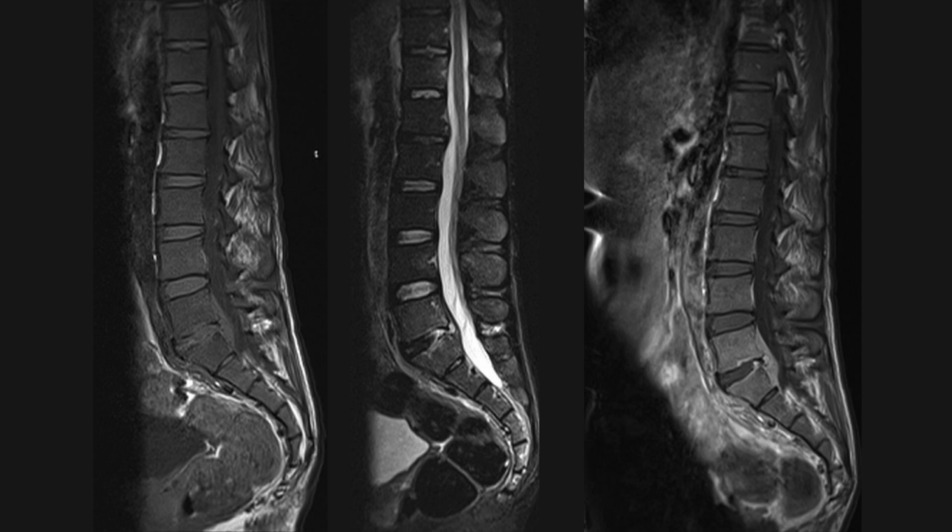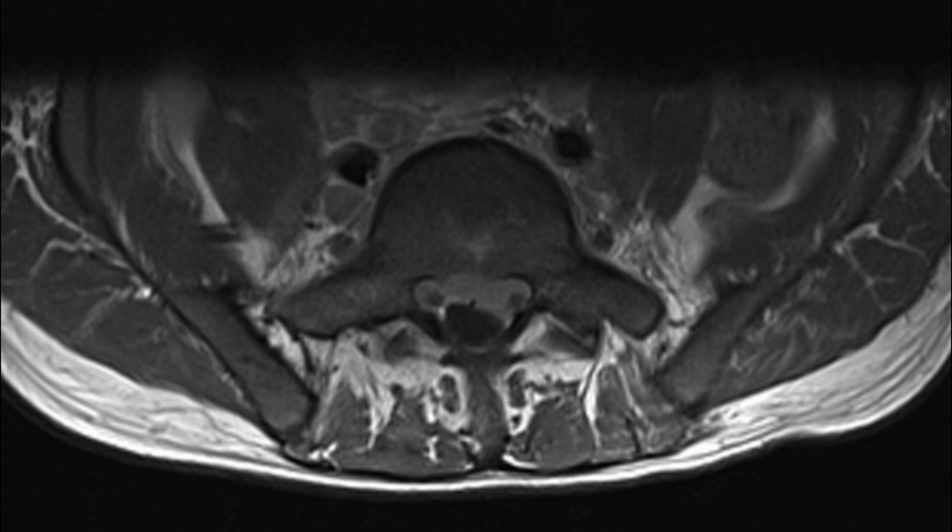But what's even more striking is the epidural extension of the infection. There's subtle peripheral enhancement of the end plate erosions and diffuse enhancement of the epidural soft tissue, which is consistent with a phlegmon. This phlegmon is actually indenting the anterior aspect of the thecal sac and extending around both L5 nerve roots, explaining the back pain this patient is experiencing.